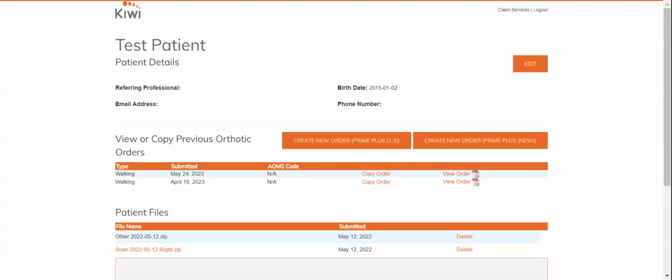Welcome to the Kiwi Orthotic Services ordering walkthrough for the advanced view. And today we'll be looking at placing a slightly more complex order from your Kiwi account from a fake patient.